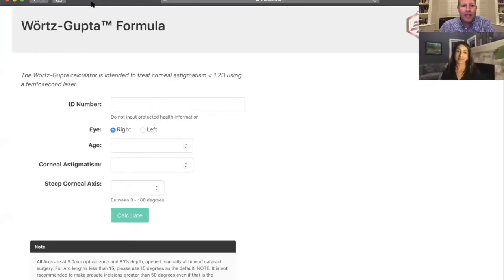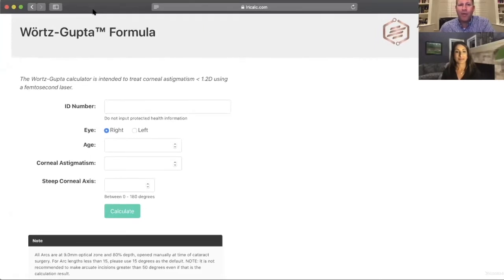So we're going to share our screen here real quick. And you'll see, once you go to lricalc.com, the first thing you'll see obviously is a disclaimer. We've already clicked through that, and you will see what you see right here, which is our homepage. You can input an ID number. We ask that you don't input protected health information, but an ID number is fine. You can choose the right eye or the left eye. Age, we will say 65. Corneal astigmatism in diopters, we'll say 1. And we'll just say that the steep corneal axis is at 90, and we'll hit calculate.